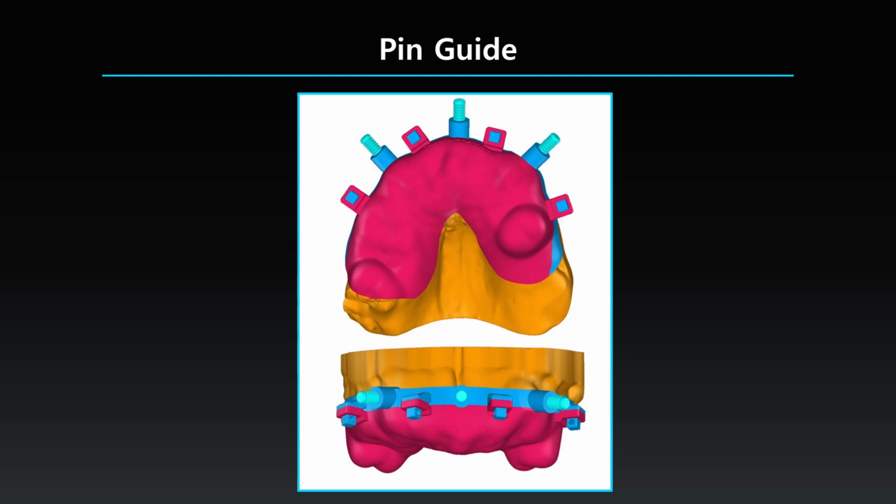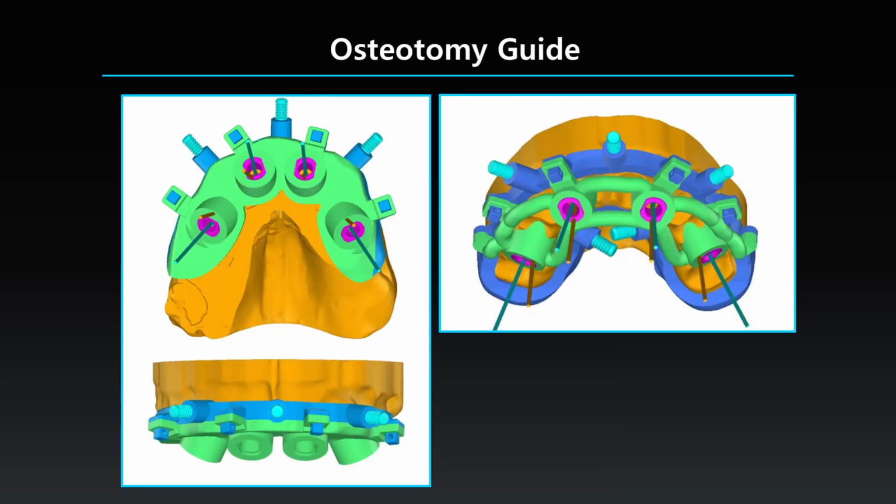Pin guide. Pin guide's only purpose is to deliver the fixation base and maintain its position while the fixation pins are set. Dentate pin guides seat on the teeth, are verified via revision windows, and ensure the surgery starts in the correct position. With edentulous patients, the pin guide will seat exactly like the denture and verify the bite and ultimate tooth position.